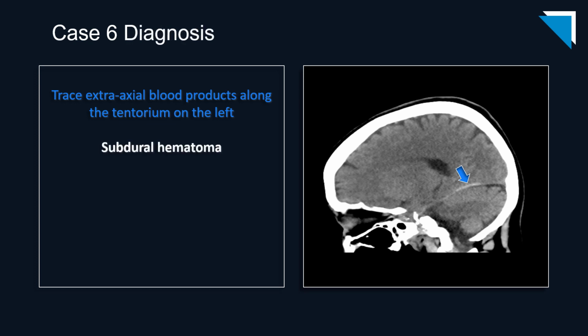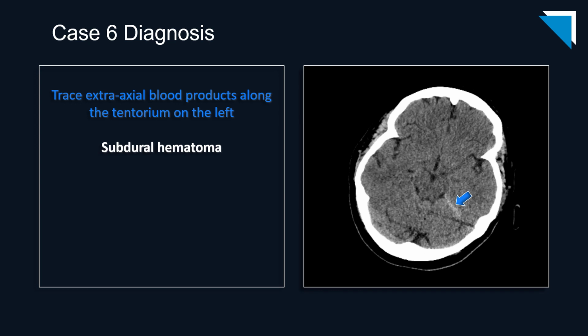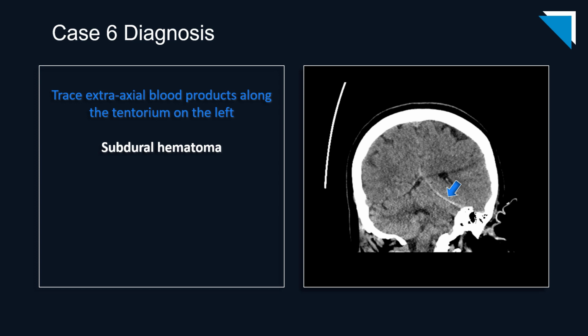So this is an acute subdural hematoma, very easy to miss in this location as you can see, but if you include it in your search pattern and utilize the sagittal and coronal reformatted images, you are much less likely to do so. This is a similar finding in a different patient just to show you how easy it is to scroll through this when you're evaluating the images. Again, it's easier to see the asymmetry on the coronal reformatted images, but this is by no means an obvious finding.